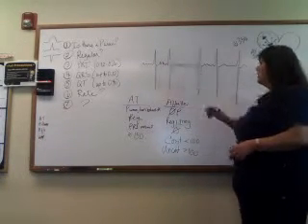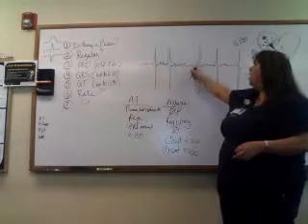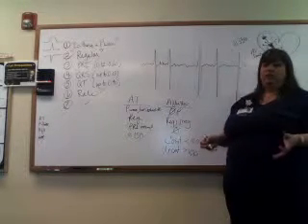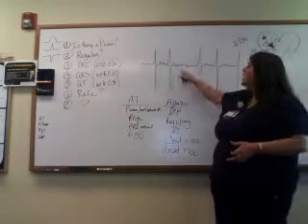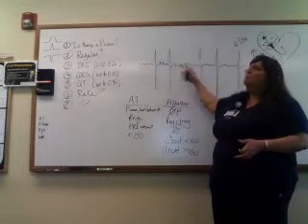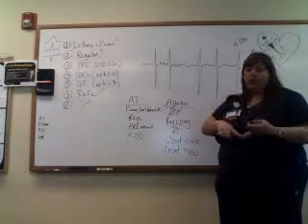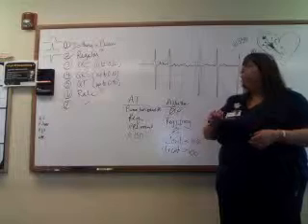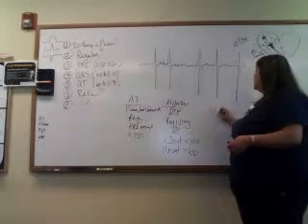So on our questions, is there a P wave? Remember the question is, is there one P wave for every QRS, consistently shaped and rounded? Where people get mixed up with this one is they'll pick a point and they'll go, well, that one kind of looks like a P wave, but it does not matter. Remember the question is, is there a consistent, regular shaped one P wave for every QRS? And when you ask the question that way, the answer is no, absolutely not. So in this one, there is no P wave.